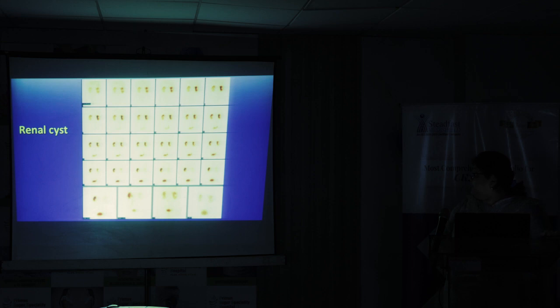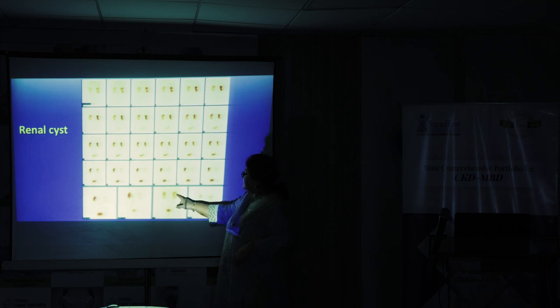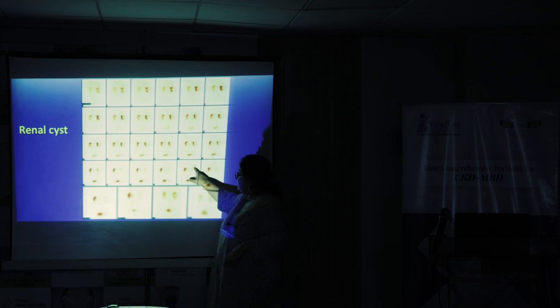Okay, so now we know the basics. Now we'll just go through some interesting images. So this is a renal cyst. So you can see that there is a little hole out here. If you look at these images, there is this hole which continues throughout the study.